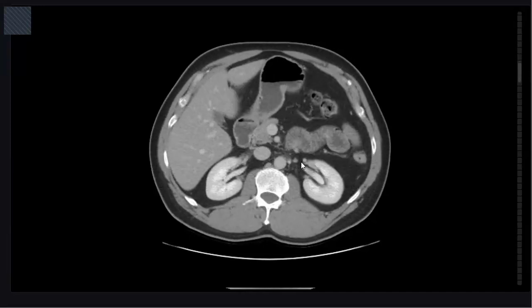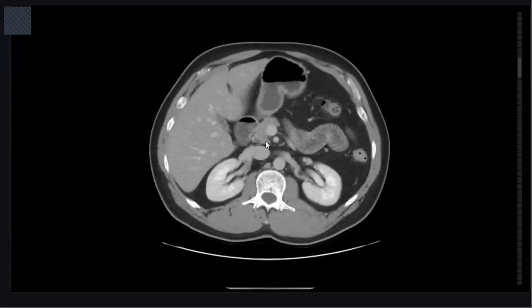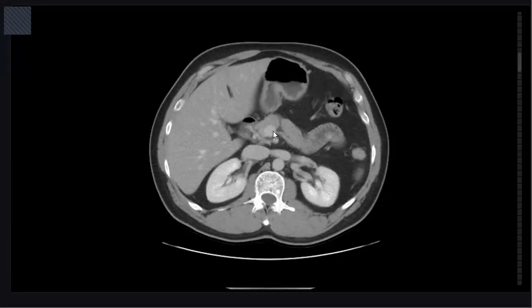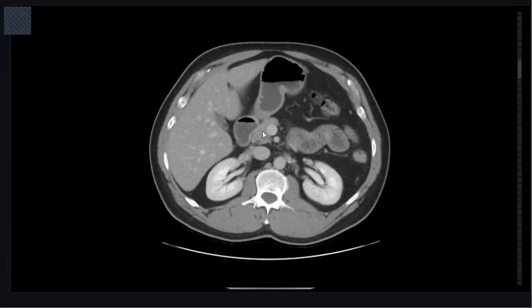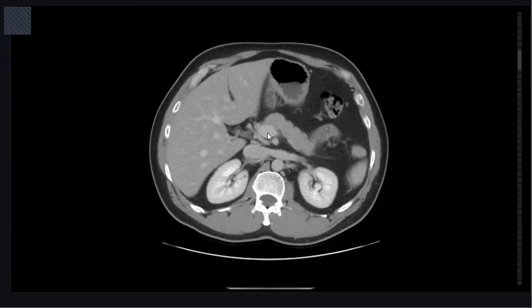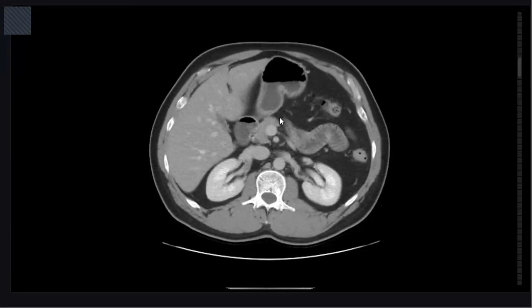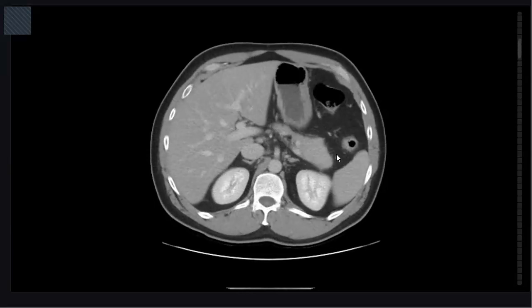Pancreas is very important because the whole pancreatic pathology are subtle pathology. If you saw our lecture in the afternoon, there is a subtle, small hyper enhancing lesion here. So in the pancreas, you have to concentrate very well because all of the pancreatic pathology, pancreatic carcinoma, pancreatic neuroendocrine tumor, and autoimmune pancreatitis can be subtle pathology. So in the pancreas, try to concentrate more.